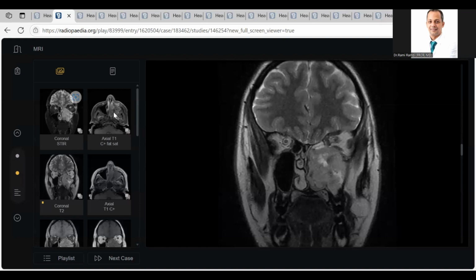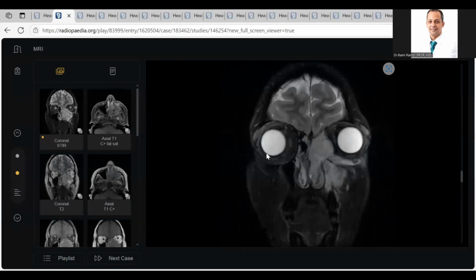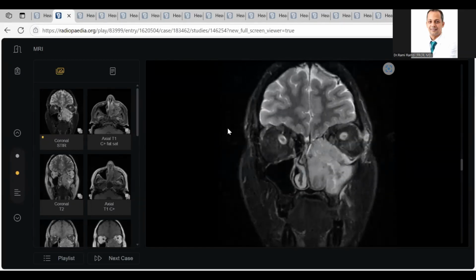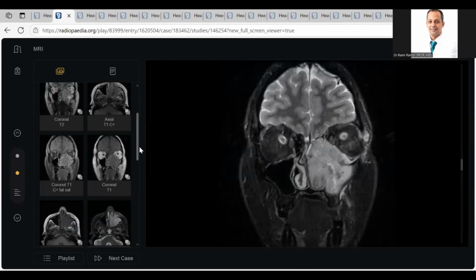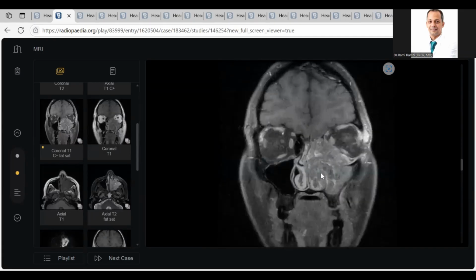The doctor will show, for example, this. He will show you like this. And you are in a big doubt: doctor, I'm in a big doubt of intracranial extension. Could you show me post contrast or diffusion, whatever available? He will show you. If he didn't have, you did your best and asked for your maximum, and the examiner will be happy. Oh, okay, there are really here. See here, I think this is meningeal involvement here. This is intracranial extension, my colleagues. It is like this, this should be our style in the exam.